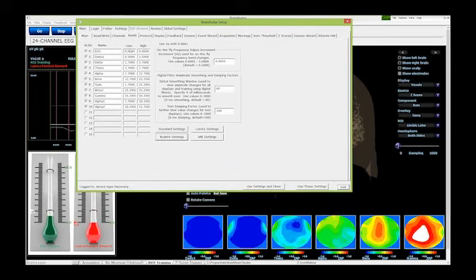So while the SMR band, 12 to 15, might be something that you want to view, it's not something that's defined for the voxels to be able to utilize. So that's why you can't view them in the voxels. Now, if you were doing standard training, non-BrainDx Z-scores, you would be able to see the SMR in the voxels. But when you're doing BrainDx, because of what we do, BrainDx takes over, and it has to be in the voxel area. Okay?